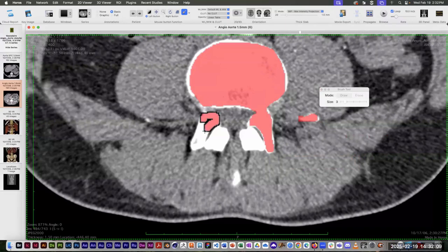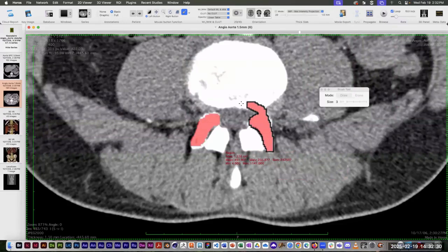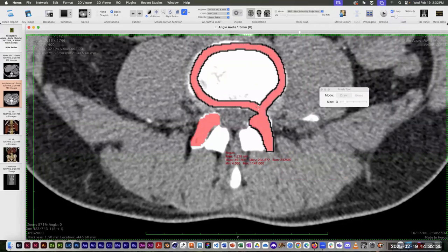And I know this is also part of that same vertebra. This is part of one of the facets, but it's not quite connected. Like we're just above or below the pedicle. So the facet joints continue above and below the pedicle, but the pedicle itself is still present on the left side of the body, which is the right side of the image. But we've gone either above or below the pedicle on the other side.